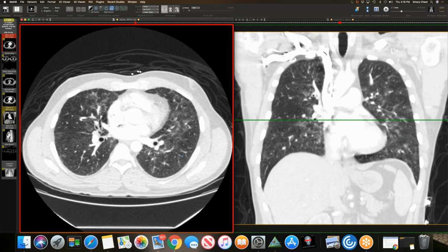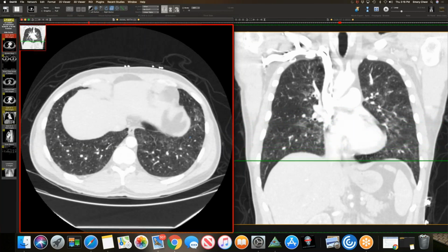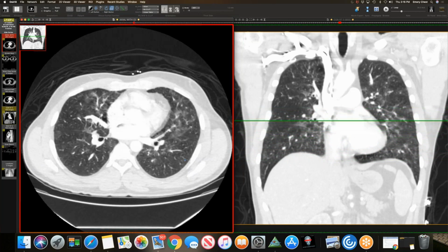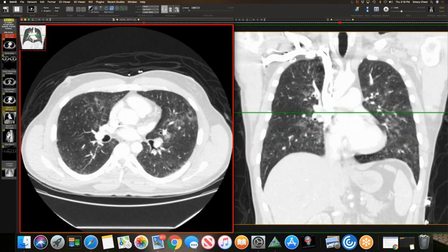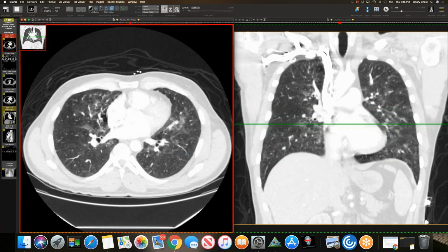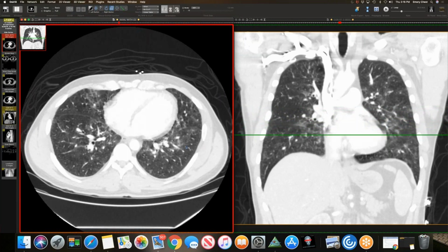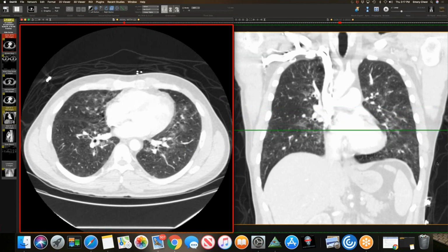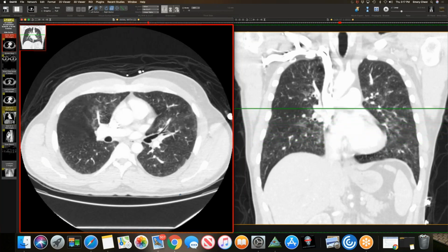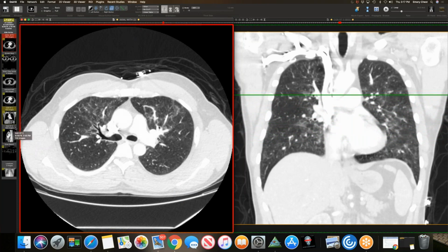The imaging pattern isn't entirely specific to fit one specific category of acute lung injury, but we thought it could be a combination of diffuse alveolar damage, organizing pneumonia, and a chemical pneumonitis from the inhaled oils and hydrocarbons. I just wanted to see what the rest of the group thinks about that, if you've seen. Yeah, definitely consistent with that. Yep, definitely. Okay.